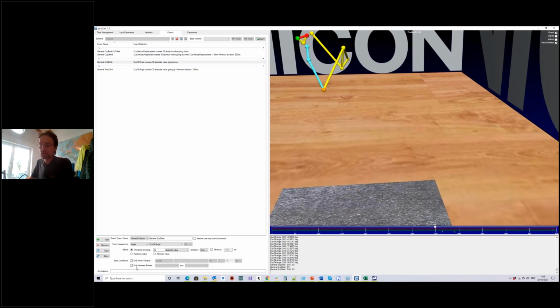The other thing we could do is to put an extra condition only when variable face to cup distance is smaller than, say, 200 millimeters. So basically, we only want to accept the end drink event when there is still not that much distance between the face and the cup. That was actually my reason for calculating that variable in the first place.